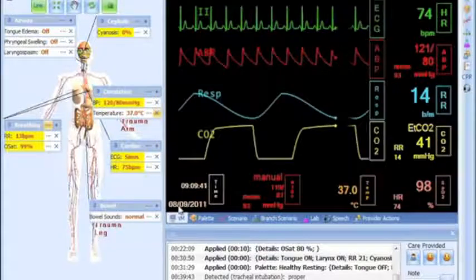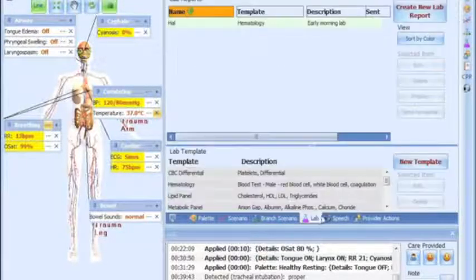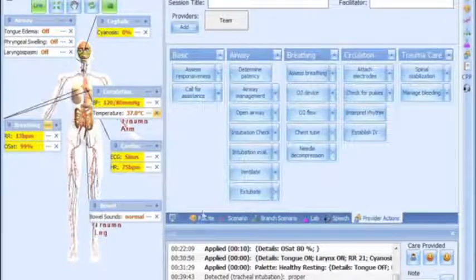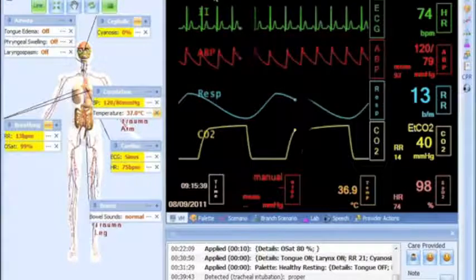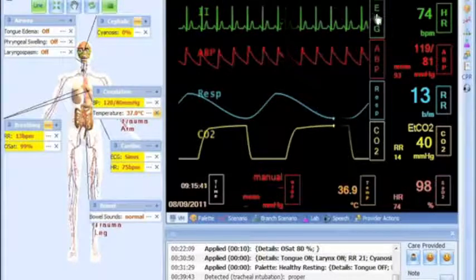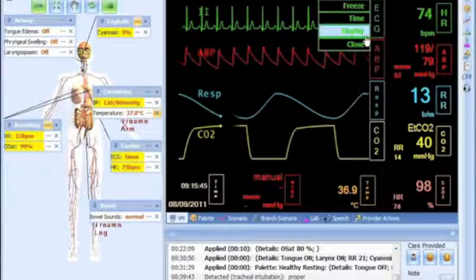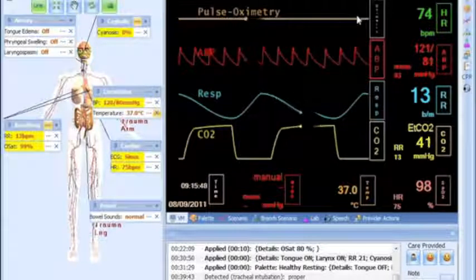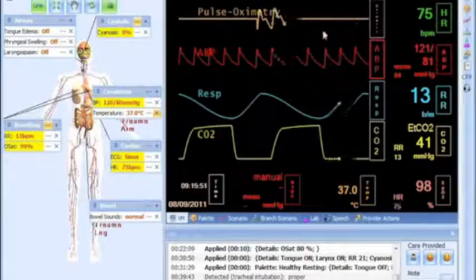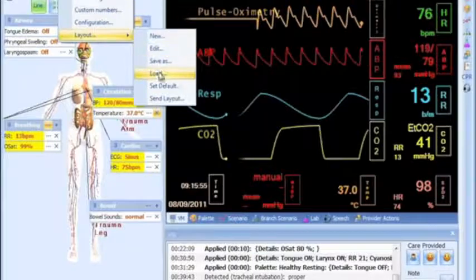Next to the status details panel, controls are organized in an easy-to-follow array of tabs. Currently, the first tab is the virtual monitor. The virtual monitor accessible to the instructor reflects what care providers see on their monitors. It also works as a status viewer for the vitals you want to keep track of without having to overcrowd the status panel. The instructor has the capability to select different monitor layouts or create custom ones if desired.